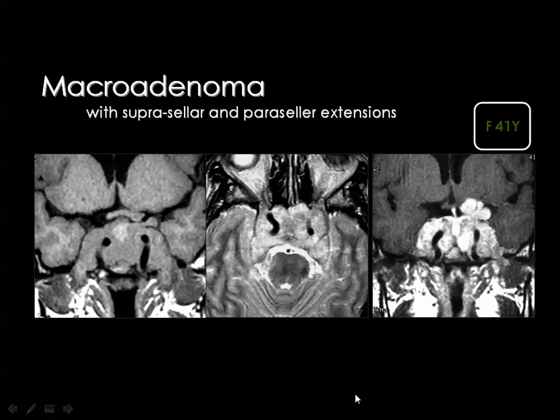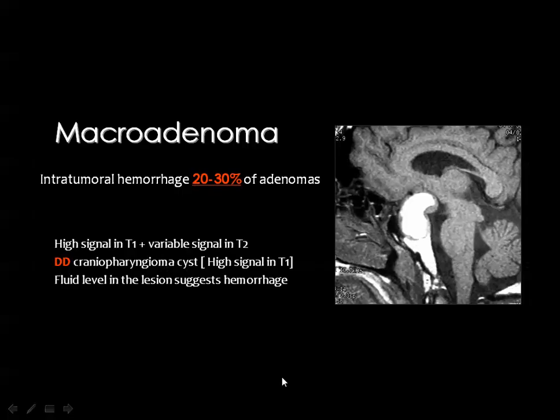One of the important issues here is that the adenoma usually does not affect the internal carotid artery. The artery caliber is maintained without encasement, narrowing, or occlusion. Then if you see that the adenoma is of bright signal in the T1 weighted image, you know that there is hemorrhage inside the pituitary gland.